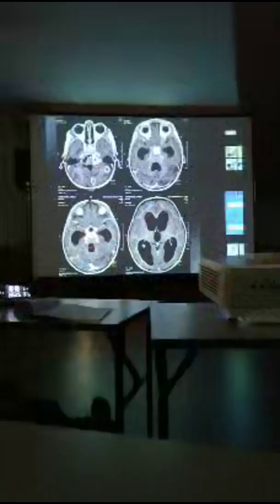Opticochiasmatic arachnoiditis will present as a dreaded complication. Patient may lose vision. You should start steroids immediately. And you can see the leptomeningeal enhancement, typically exudates in the basal cisterns, presenting as hydrocephalus. It may involve the vessels, and it may present as hemiplegia. So in neurotropic as well as angiotropic agents, this is the manifestation in various phases.